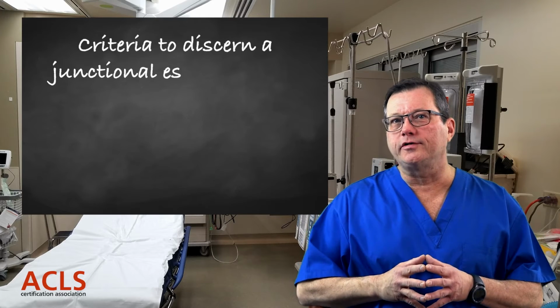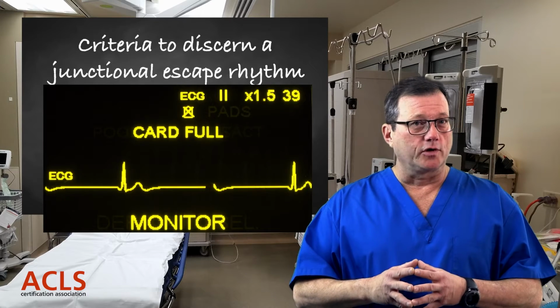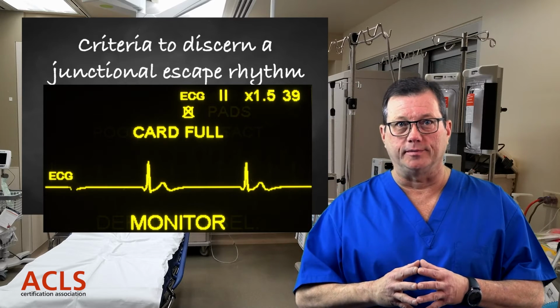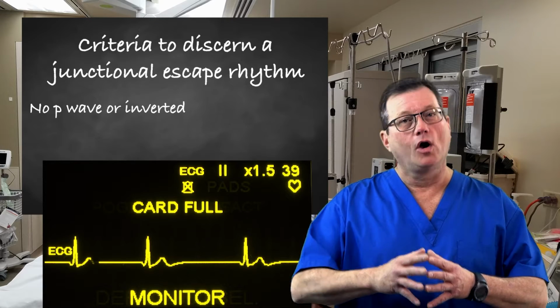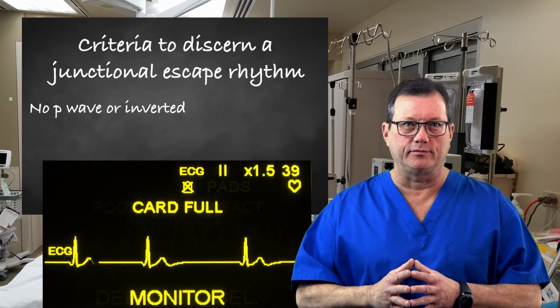Okay, so what's the criteria we use to discern a junctional escape rhythm on our ECG tracing? First, look at the P wave. You won't have one. And if you do have one, it will always be inverted. This inverted P wave may appear before the QRS or after the QRS, or if it gets lost within the QRS, there will be no P wave.